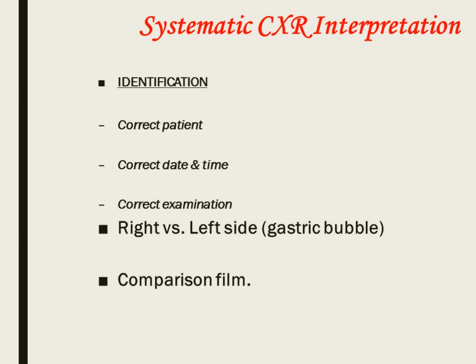And always, if there is something to compare it to, that's very helpful. If I look at an X-ray from today of somebody on a ventilator, I always like to pull up the one from yesterday or 2 or 3 days ago, because I want to see the progression, the improvement, and what was there before. Obviously it's very useful for following up things like pulmonary nodules, when we look over months, but in an acute setting, looking at the one from yesterday or 2 days ago is very helpful.